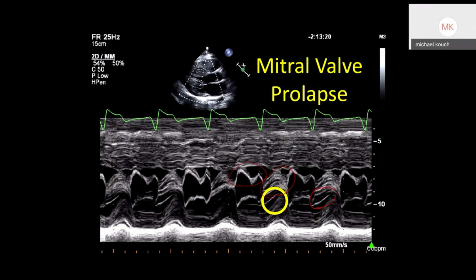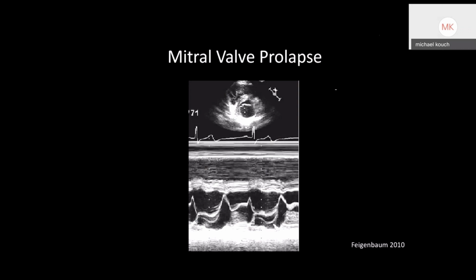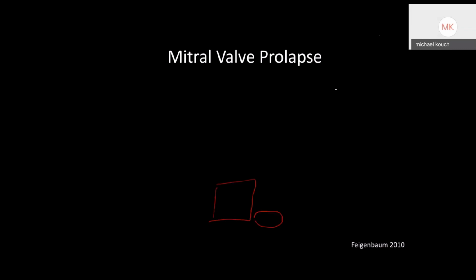So normally you would want these two to be stuck together, but we see evidence of that posterior valve going backwards. All right. Here's another great example of mitral valve prolapse, where here we see our normal diastolic section, right? But as we come together and we want the leaflets to form one singular structure, we notice that this mitral valve leaflet is prolapsed posteriorly, and you may have some regurgitation there, okay? These are two very high yield findings, both in clinical practice, but also on your board exams.